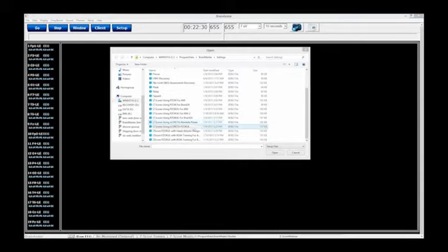Z-scores using sLORETA PZOK upper and lower, on the other hand, is much like our surface training, where we focus on a larger amount of Z-scores, and we reward the percent of Z-scores that are within our upper and lower ranges.